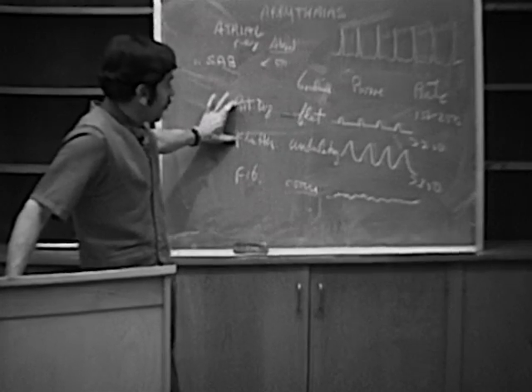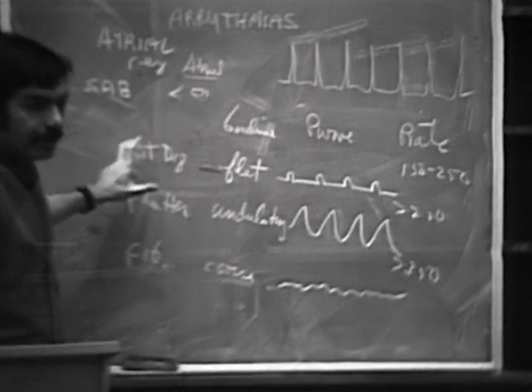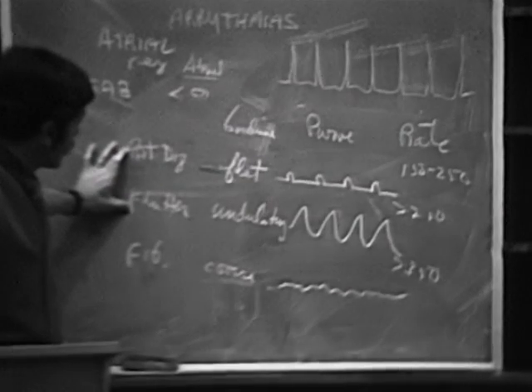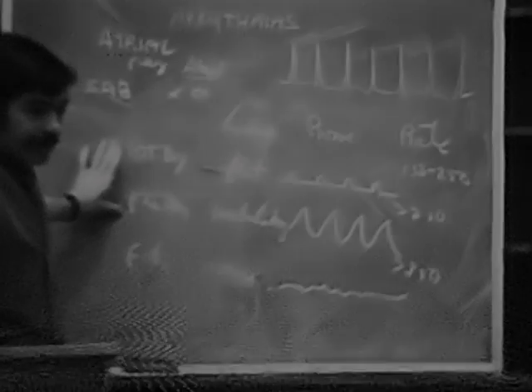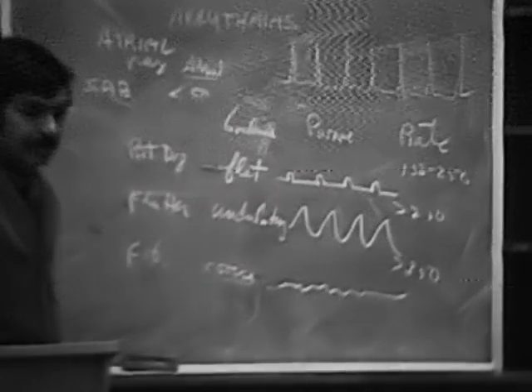Now, this is a very important differential, right? But it can be very difficult, and you have to use clinical judgment as well as all the information that you have on the EKG. And this is one of the most difficult problems in cardiology, really, sometimes, is differentiating PAT with block from flutter. It may have sounded easy, the way I just described it, but it really isn't.